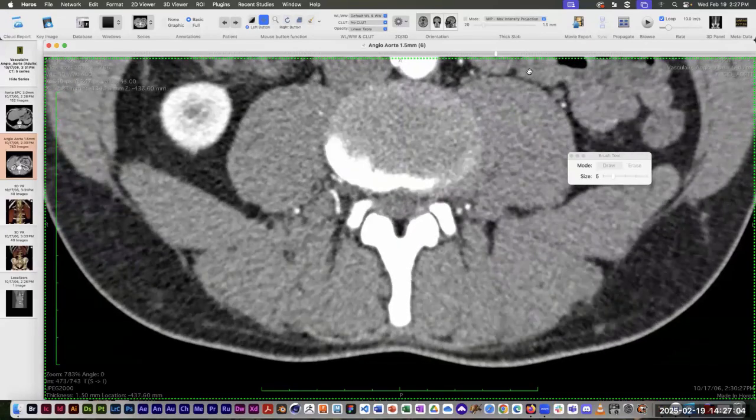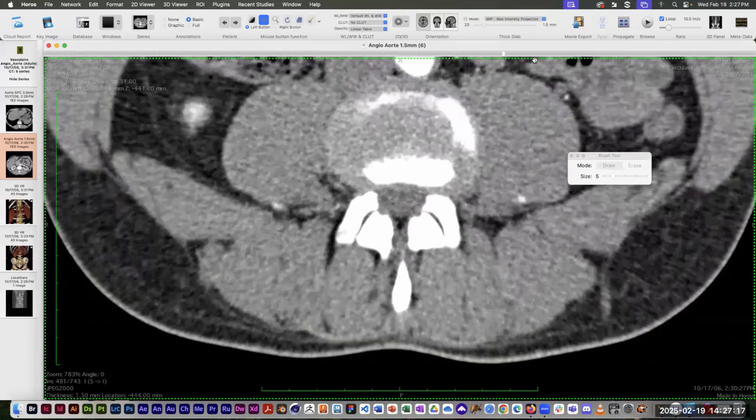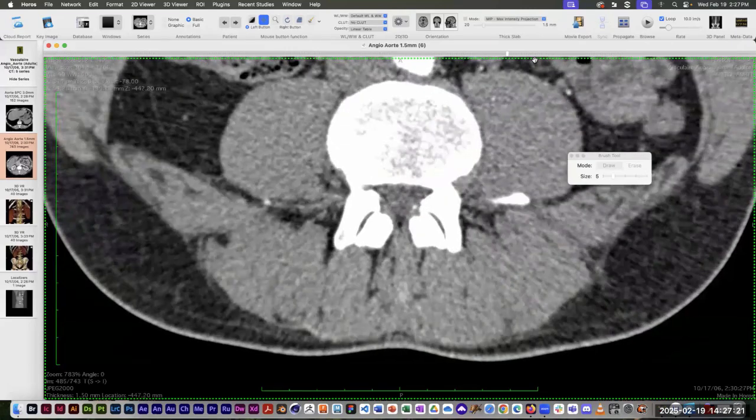And the tricky thing about doing this is, you know how the vertebrae overlap one another? Sometimes it's hard to know what's part of one vertebra and what's part of the one right above and the one right below it. So we're going to try to figure this out. Sometimes it's helpful to start here where we can actually see the body, the pedicles, and these would be the facet joints back here. So I know that's all part of one vertebra. Then I can kind of go up and down from there.